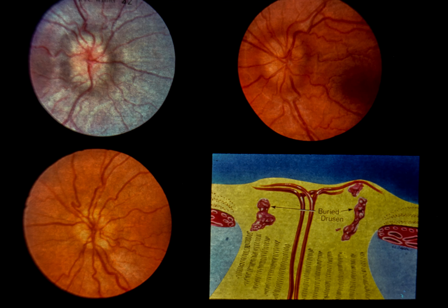In most cases of optic disc edema, the major disc swelling occurs at the periphery of the disc, so that the central cup is generally preserved even in advanced cases. Third, although the retinal vessels may be tortuous and have an anomalous branching pattern in eyes with optic disc drusen, the vessels are not dilated and do not leak fluorescein as in optic disc edema. Fourth, normal retinal nerve fiber layer striations are preserved up to the disc margin in eyes with optic disc drusen, but are lost due to axonal swelling in eyes with optic disc edema.